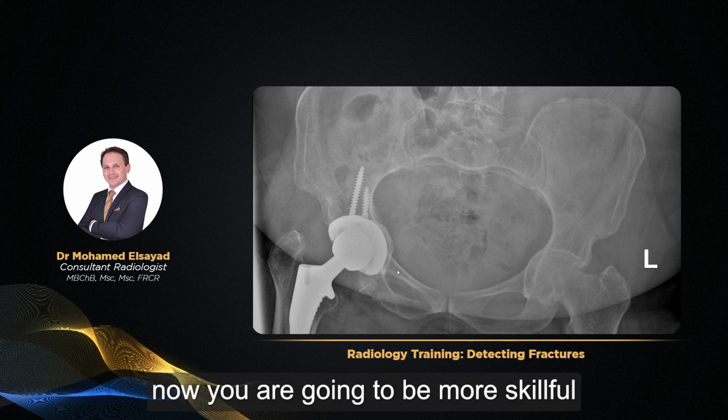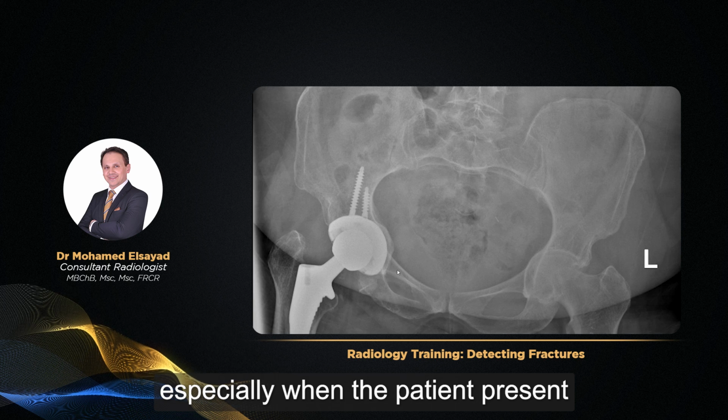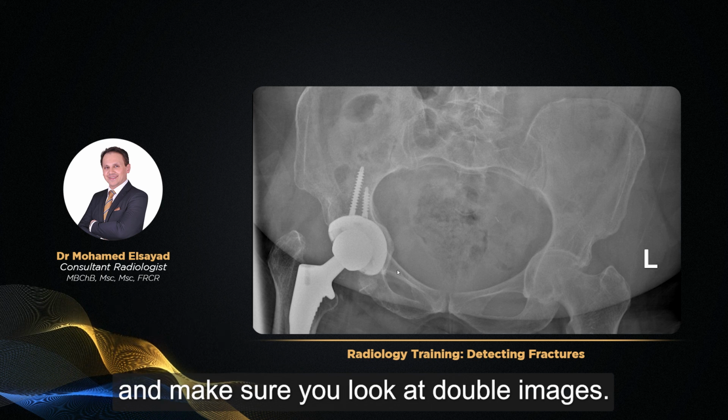I am confident that now you are going to be more skillful in detecting such difficult fractures, especially when the patient presents with persistent pain for the second day. Don't take it lightly. Make sure you follow the lines of the cortices and make sure you look at double images.